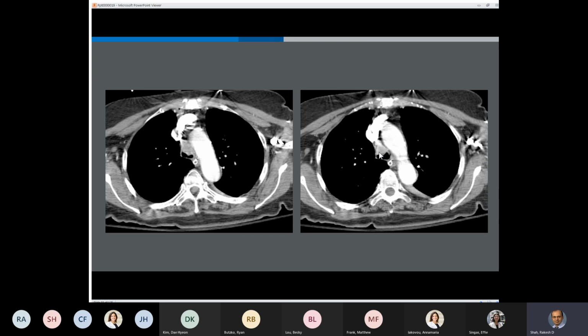It is very hard to tell what it is, but in this individual who was a smoker, we thought it was going to be a squamous cell, and we biopsied, and that's what a squamous cell carcinoma of the trachea will look like. They tend to arise from the mucosa, so when they do grow, they protrude into the lumen of the airway and will kind of occupy it.